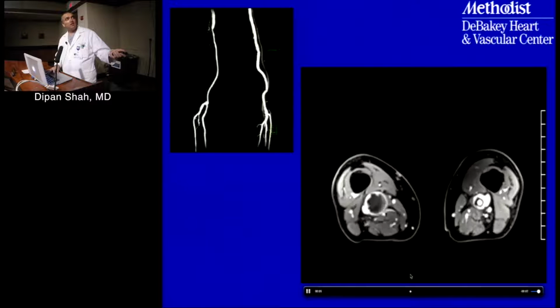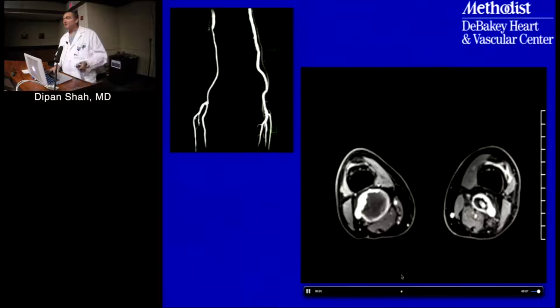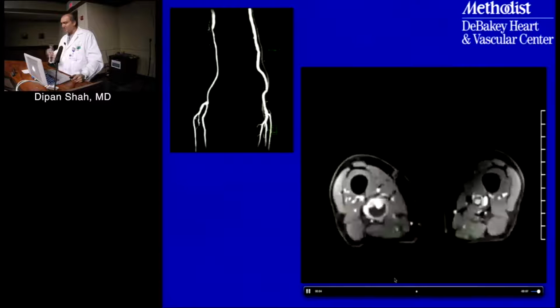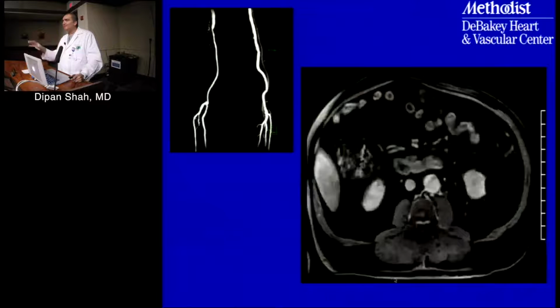So here you've actually got huge aneurysms of the SFA and the popliteal with a normal or mildly enlarged lumen size. So the picture is very, very different compared to what it was without doing that. And so again, it stresses the importance of making sure that you always do post-contrast imaging using a technique where you can see the entire vessel, not just the luminogram itself.